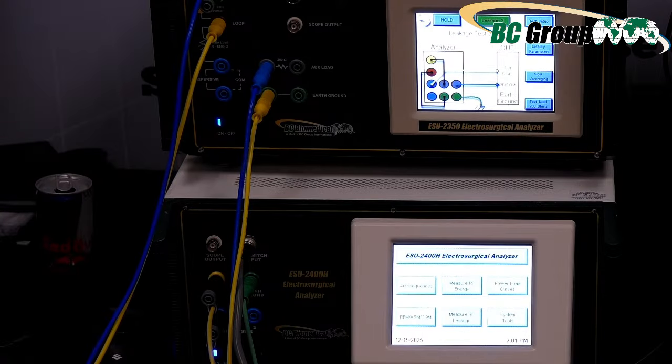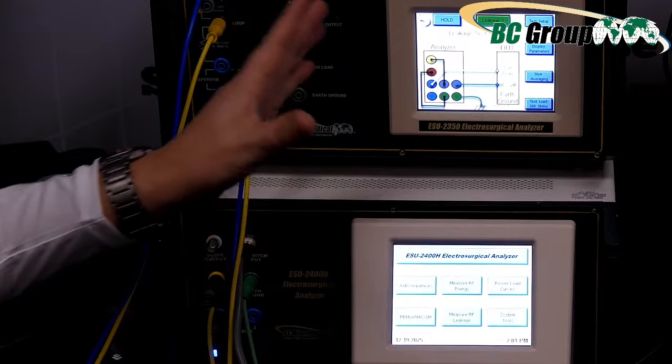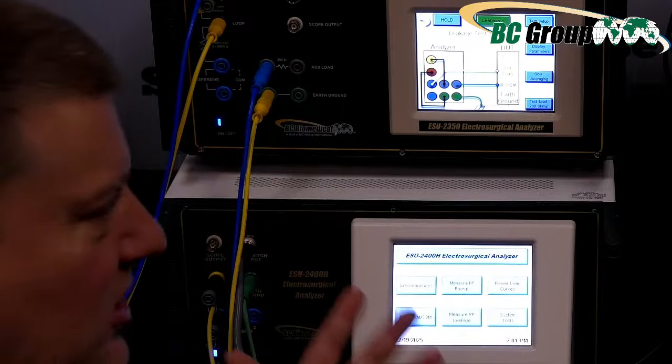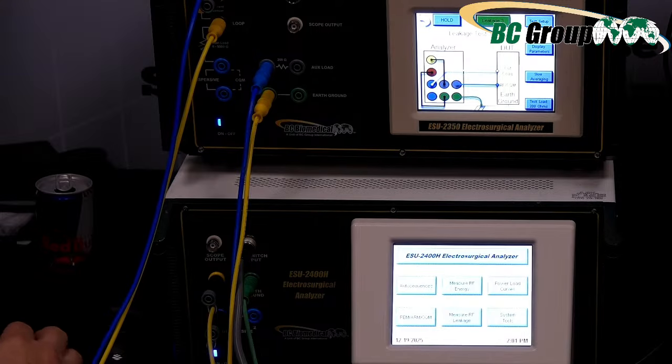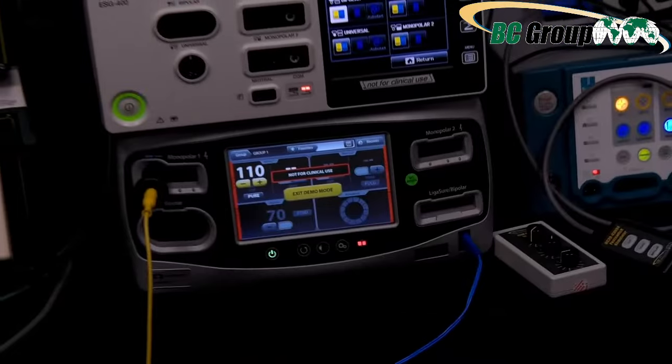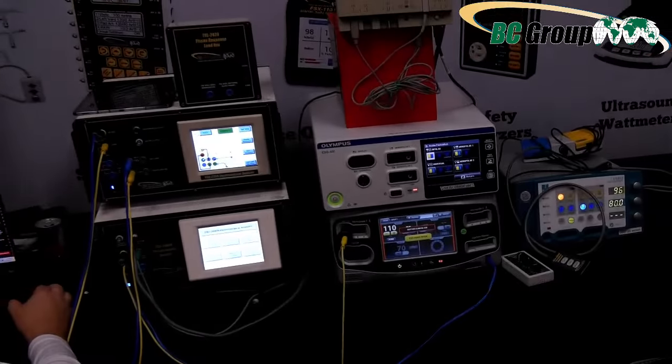And for the most part, guys, I know I'm completely out of time. I'm going to apologize for that, guys. There's so much to cover here. I just want you guys to, first off, be aware. Here, let's go ahead and zoom out, guys. Right? Image. Auto exposure. Let's do this.